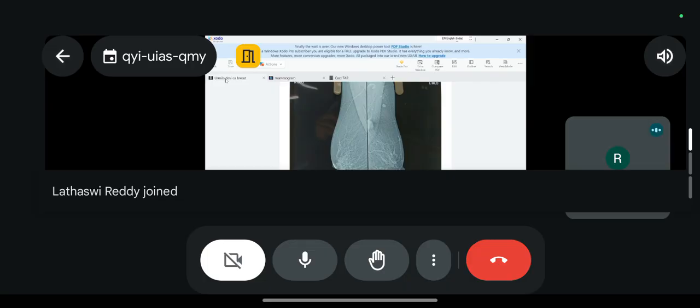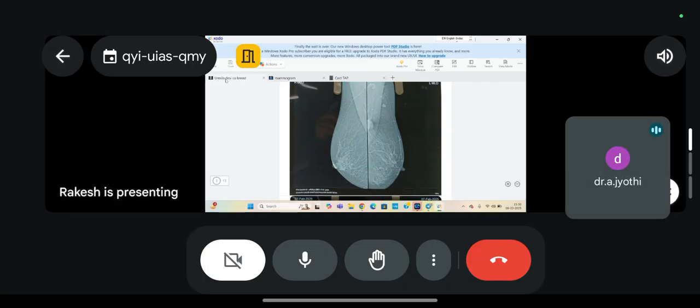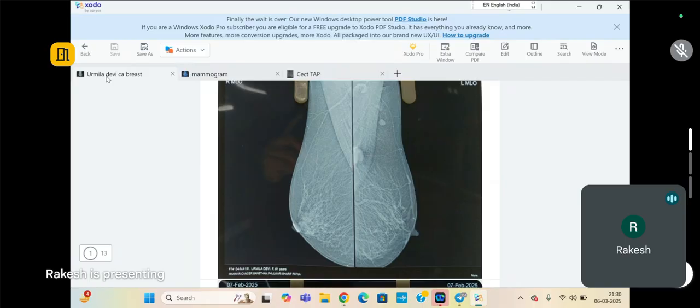So how do you describe a lymph node? First we will give the size, then the cortex thickness, thickened cortex, loss of fatty hilum, vascularity, and whether it is heterogeneous or homogeneous. Go in an order so that you will not miss anything.